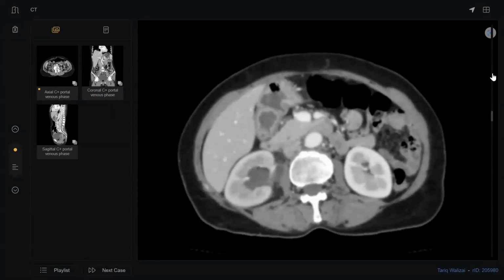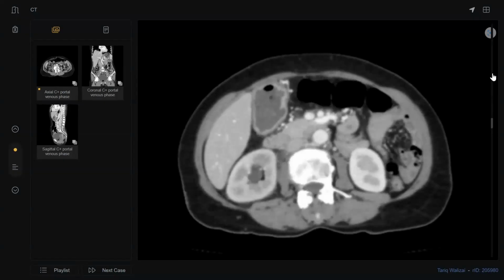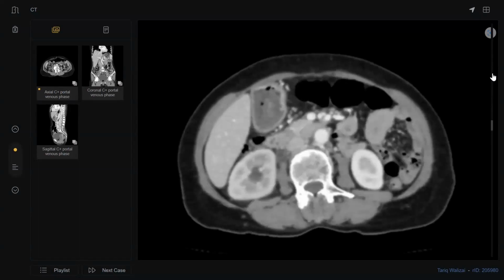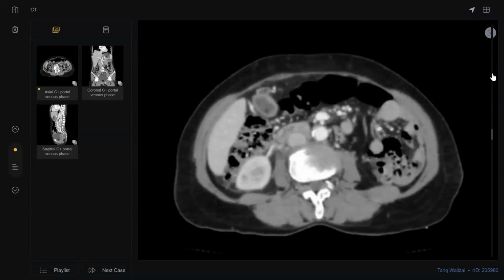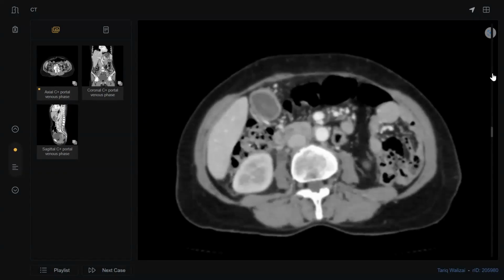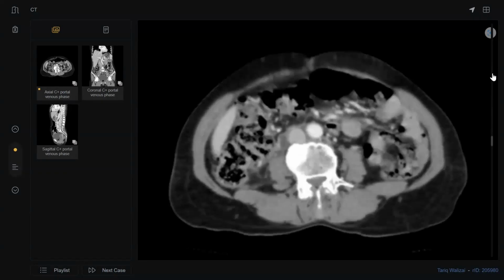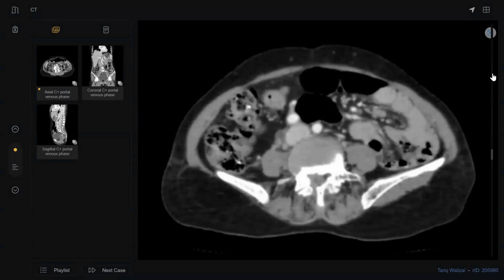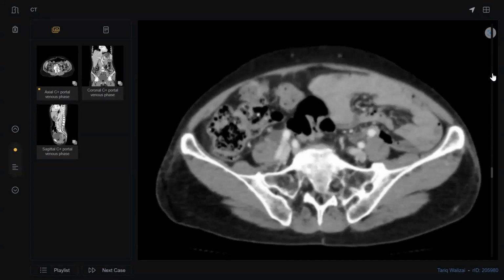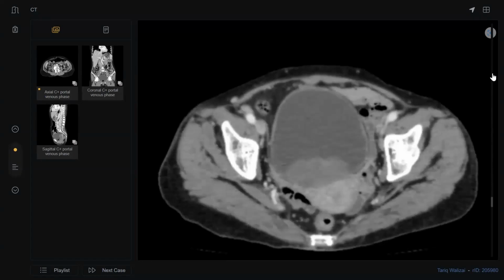The hypodense component is filling the pelvicalyceal system. I'm trying to see the pelvis. Do we have the post contrast, the excretory phase images? I would like to see the excretory phase images also. Sir, there is a big lag, it is not responding. I'm scrolling down to see.